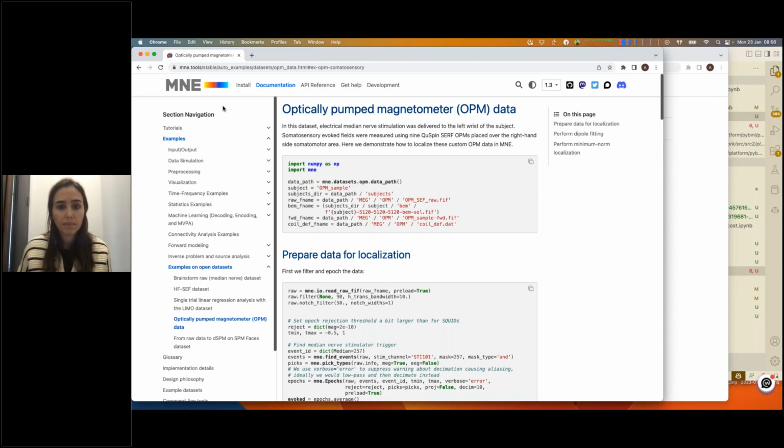You can put all this in one file, and MNE is pretty good at understanding that there are different things, compared to other packages which are historically pure EEG, where the notion of channel type is not a first-class citizen. With MNE, you can have very clear control of channel types, and this allows us to automate and make the right decision when we have combined channels. Therefore, MNE allows you to do, for example, a beamformer using combined gradiometers and magnetometers, and that's not an issue.